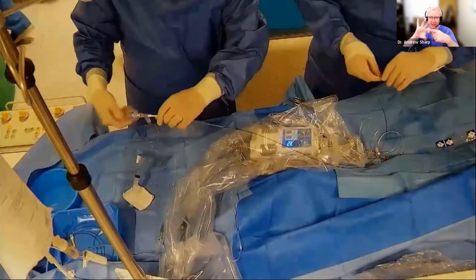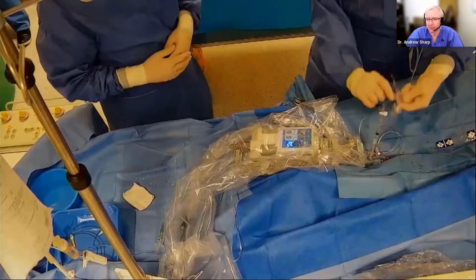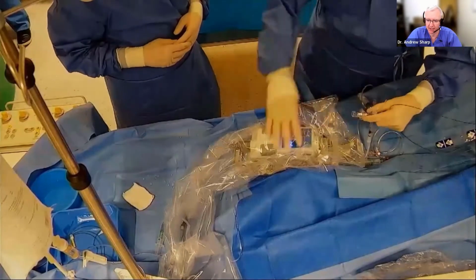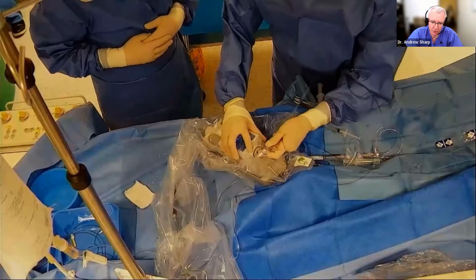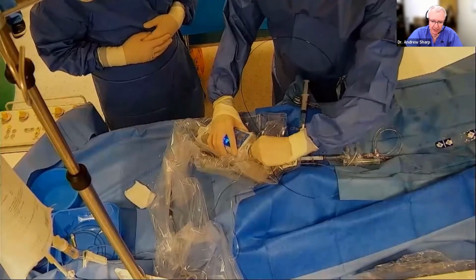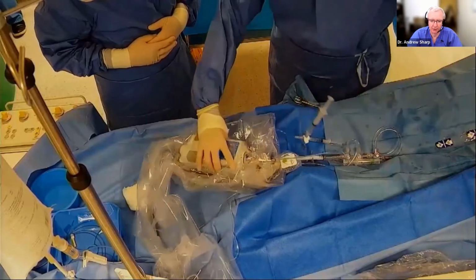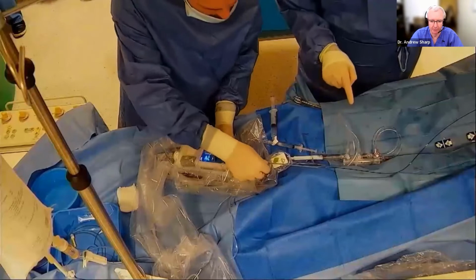So remember, the rotational IVUS is within a plastic sheath. And then there's a black dot, which is on the base of the IVUS catheter. And that goes in at the base of the arrow there, which I'm going to show you in a second where my finger was. And then we rotate it round and it clicks in. Okay, so that's the device now prepped, and it's taken me 2 minutes.